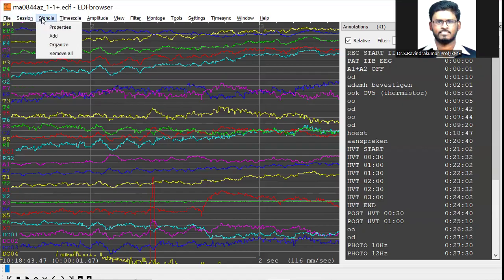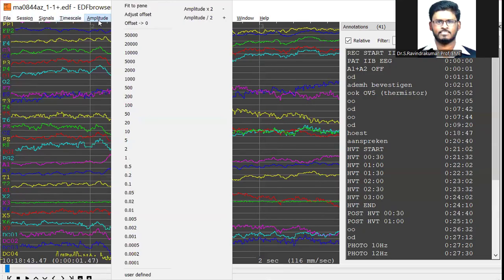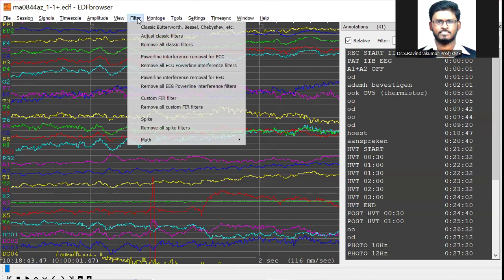So this software helps us with different features, and these features are very helpful for analyzing the EEG signals at a research level or for product design also. EEG is a very complex signal. ECG is very easy to analyze, but EEG signals are very difficult, and even myogram signals in the low frequency area are very difficult to analyze in terms of the detail of the muscle activity. So those signals can be brought here, and we can analyze them in detail.